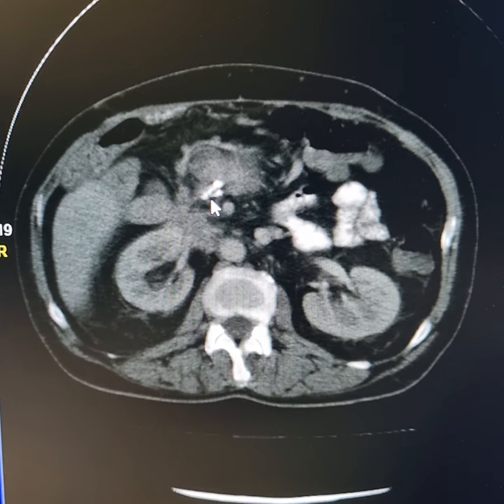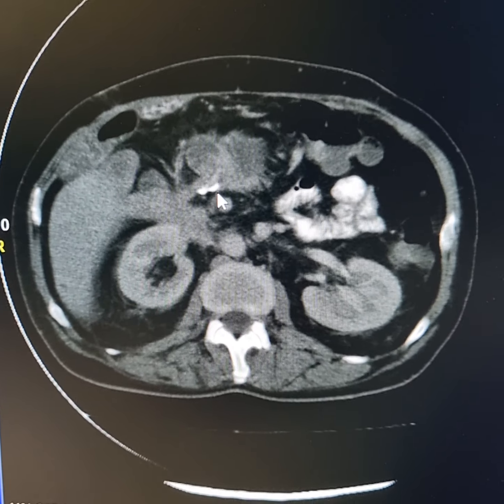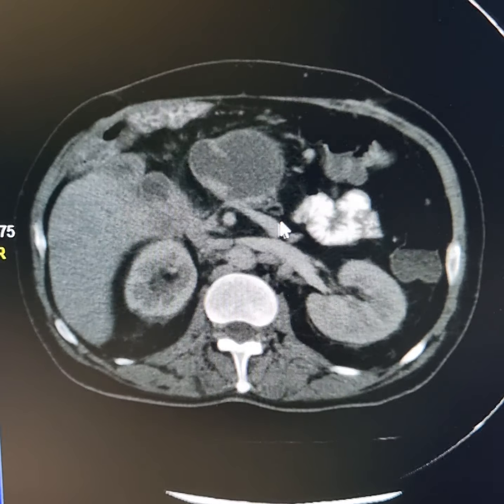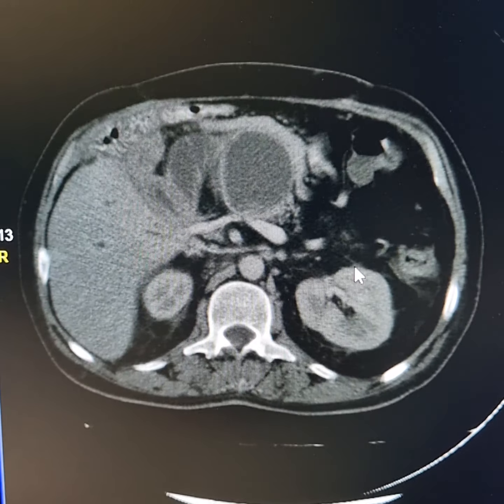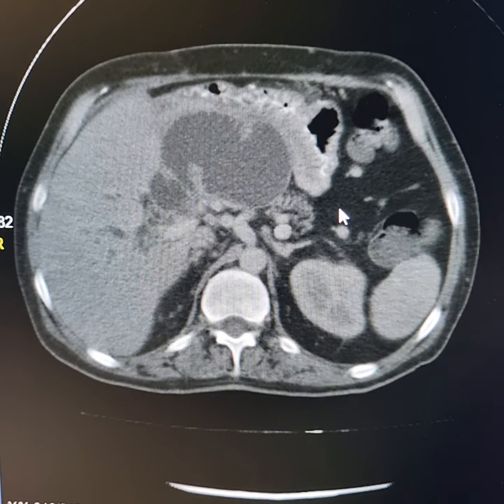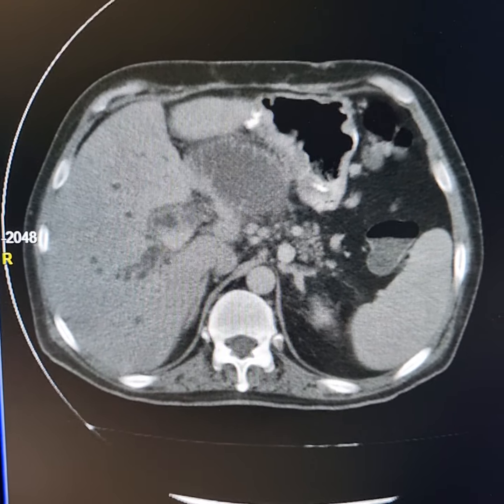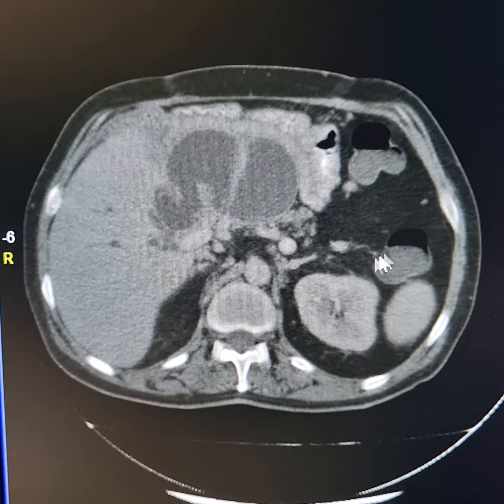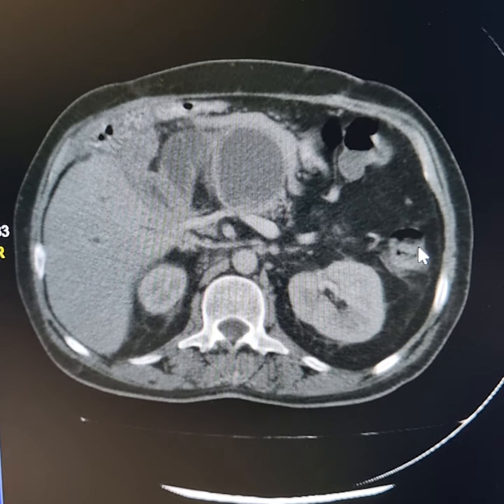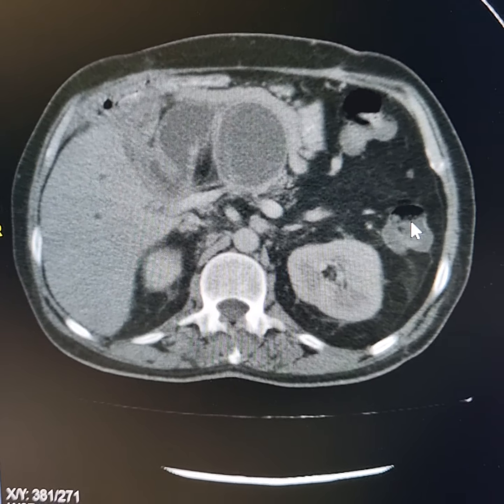This is the region of the head of the pancreas. There is no recurrence of mass here. Calcifications and metallic clips are seen here. The rest of the body and tail of the pancreas are atrophic. Sub-centimeter sized lymph nodes are present in the left para-aortic region, like this one here. Its maximum diameter is approximately 9.0 mm along its short axis.